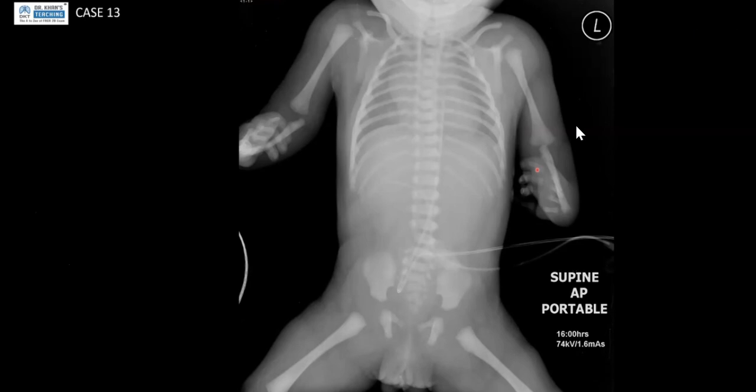For this radiograph, I don't see any gas bubble, any gas shadow in the abdomen. And also I see there is some linear tubular structure in the upper part of the esophagus. So I am going with esophageal atresia, complete esophageal atresia without fistula.